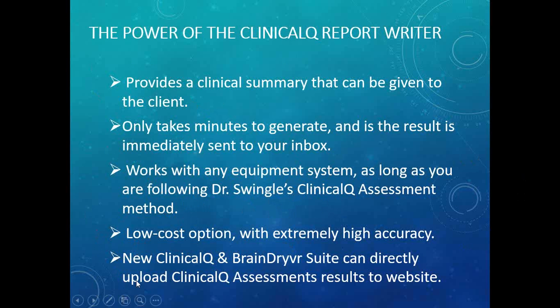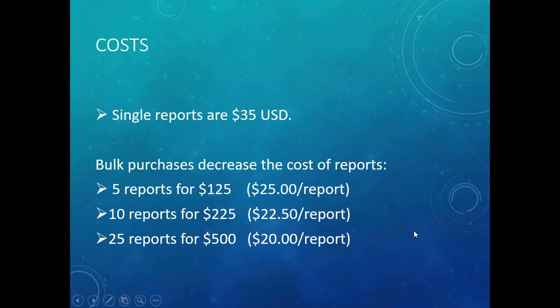And one new thing is that the new updated ClinicalQ BrainDryvr suite can directly link to the website. So using the BFE suite, it's just that much quicker to automatically send stuff. But like I also mentioned, anyone's software method, regardless of what software or equipment you use, can have a quick, immediate upload to the website as well.